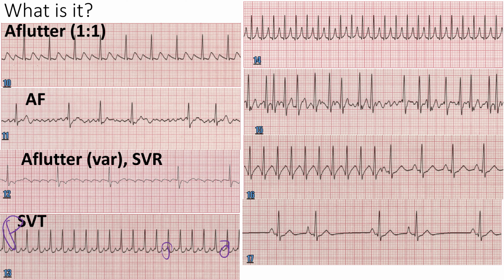And again, when the heart rate's fast and we don't know if it's PSVT or A flutter with a 1-to-1 response or all these other fancy things, sometimes they will give adenosine to slow it down enough so they can see what's going on. Okay. And also the T waves are a little peaked.